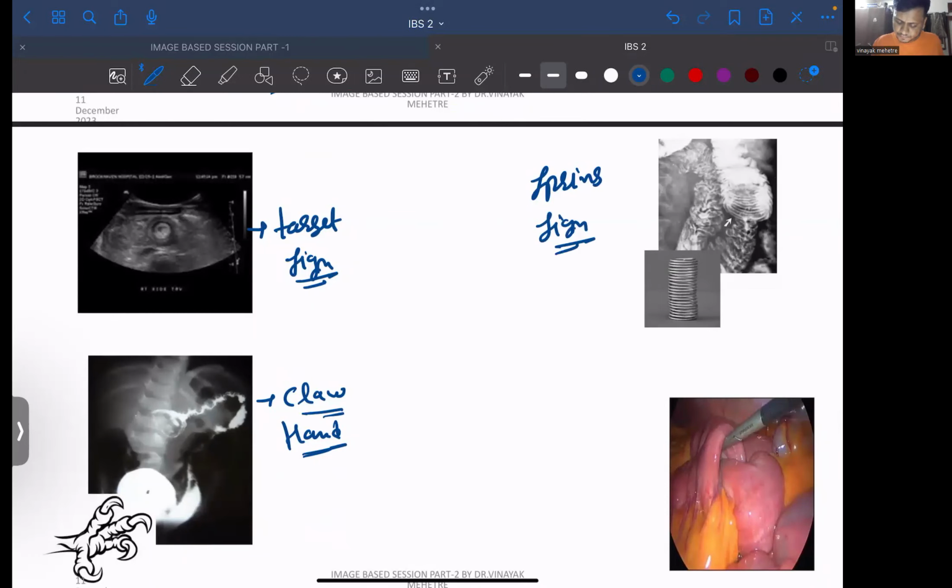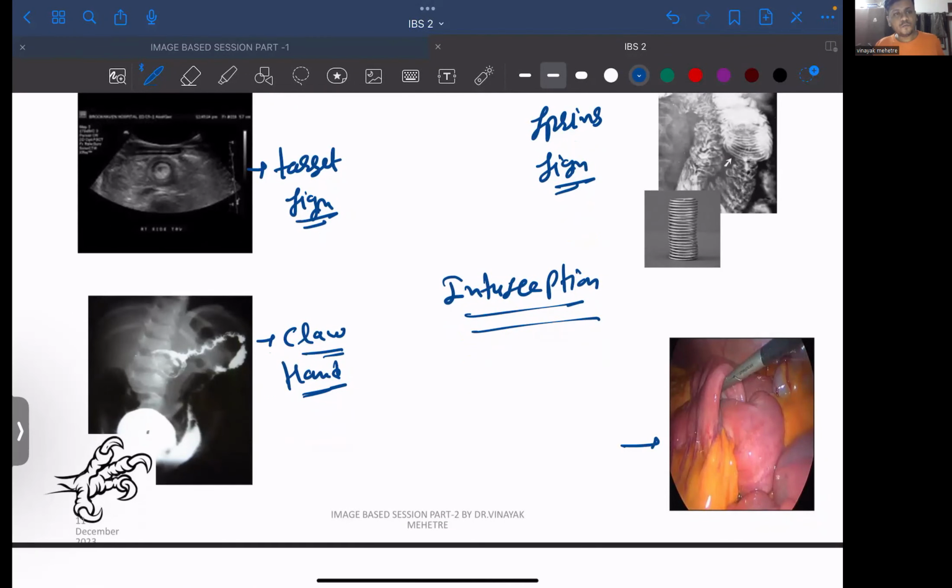कहाँ मिलेंगे? इट इज सीन इन इनटूससेप्शन. इट इज सीन इन इनटूससेप्शन, राइट. करेक्ट, स्पेलिंग करेक्ट कर लेना बाद में, राइट. वन पार्ट ऑफ इंटेस्टाइन वेंट इनटू अदर पार्ट ऑफ इंटेस्टाइन. क्या हुआ? पाइप के अंदर ही पाइप चला गया. दैट इज कॉल्ड एज इंटेससेप्शन. ओके, इनटूससेप्शन.